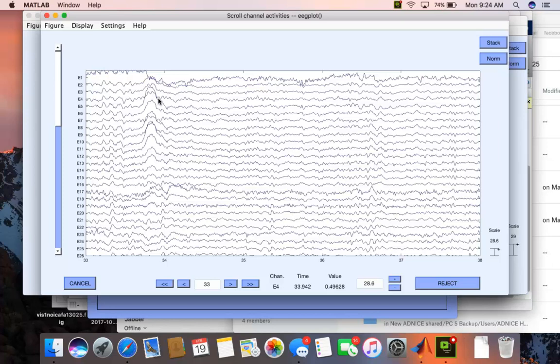When we do a frequency-based analysis of a data set, we're making an assumption that the data are fairly stationary. If you're not from an electrical engineering background, stationarity of the data means that the spectral characteristics over time will not change. In this case, clearly, you have some time localized events that, if we were to capture a Fourier spectrum, power spectrum here, it might look quite different than if we captured it over here, say at 36 seconds. So the data are not stationary.